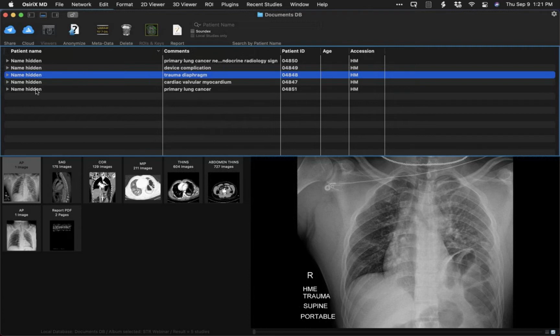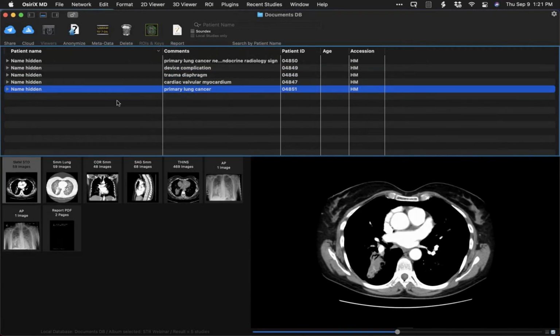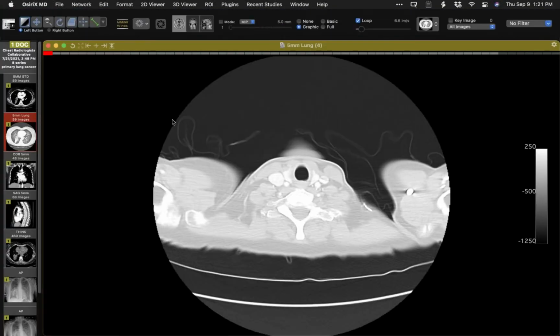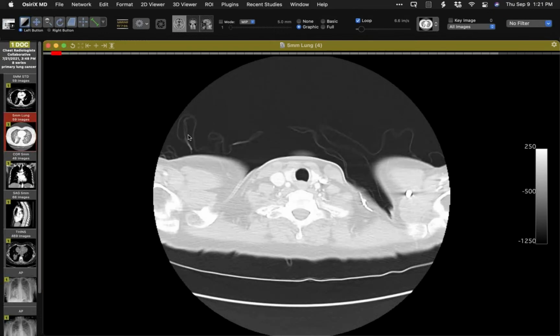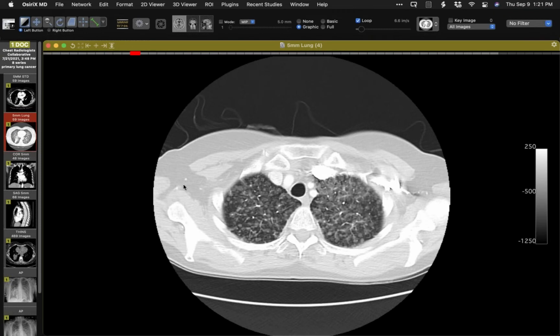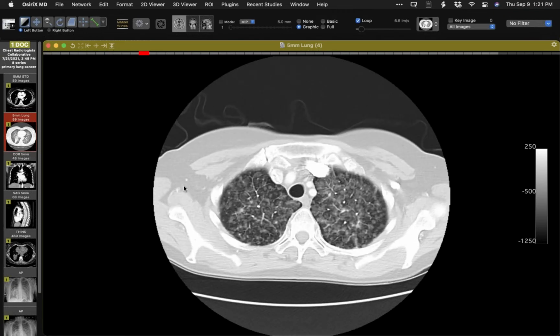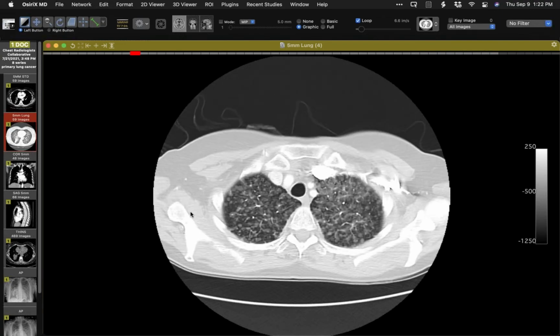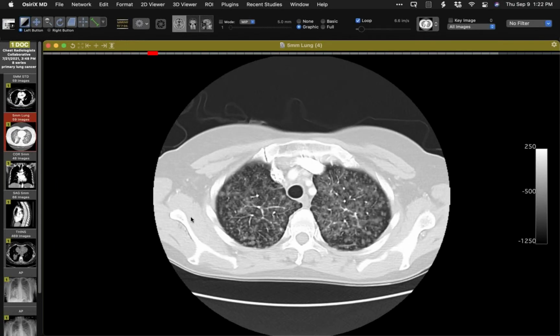Okay, this one. Yeah, this is a pretty dramatic imaging pattern and growth of tumors. So what to make of it if you didn't have any history about this? I'll scroll quickly from top to bottom. So of course, here we have ground glass attenuating opacities, GGOs, of varying sizes. Some of them are fairly round and discrete. One might imagine that they're forming in the central portion of the pulmonary lobules, adjacent to the lobular membranous bronchioles.